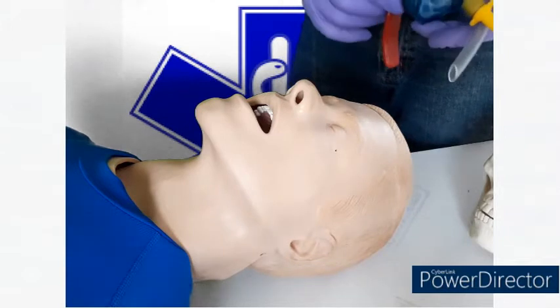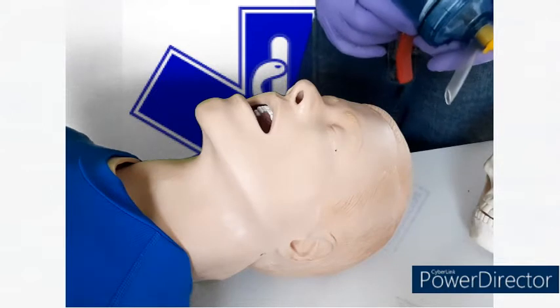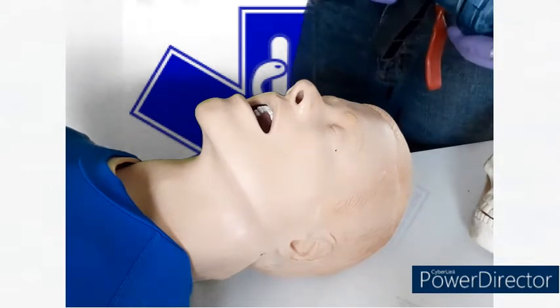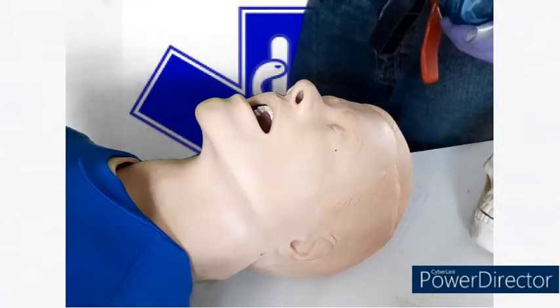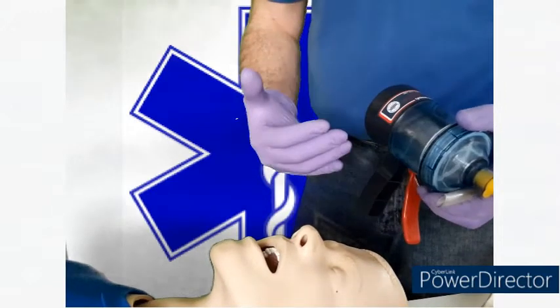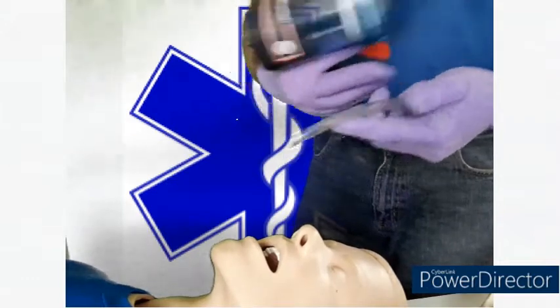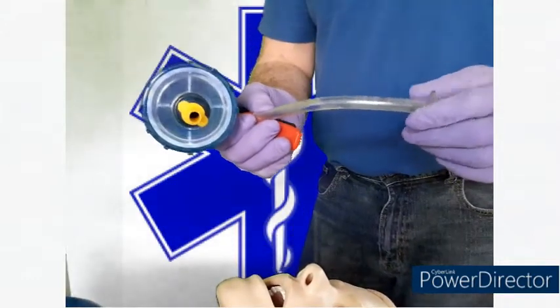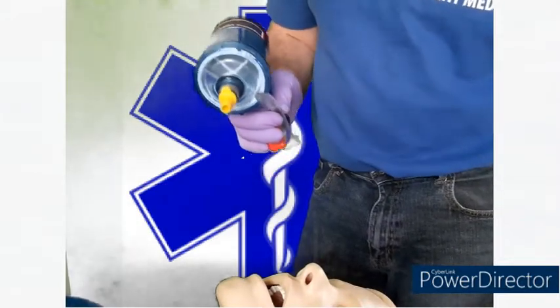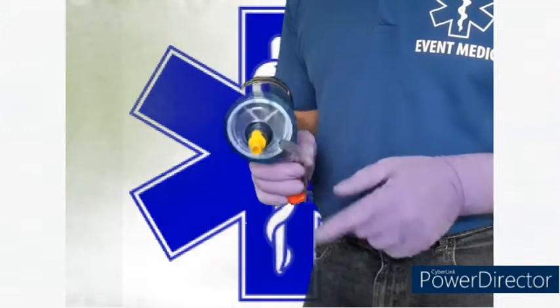These come in lots of different sizes, shapes, colours, manufacturers. Most of them these days are single patient use because of infection prevention. This is an older style one, which traditionally would be cleaned out, but I wouldn't anymore. Once this is used for real, I would then use this single use and dispose of it. With the catheter, I'm just using a size 8 nasopharyngeal as a catheter, which again would be in a sterile packet when I first opened it.